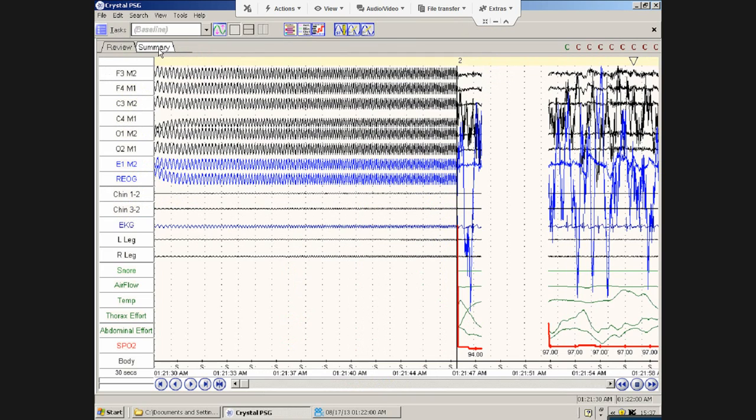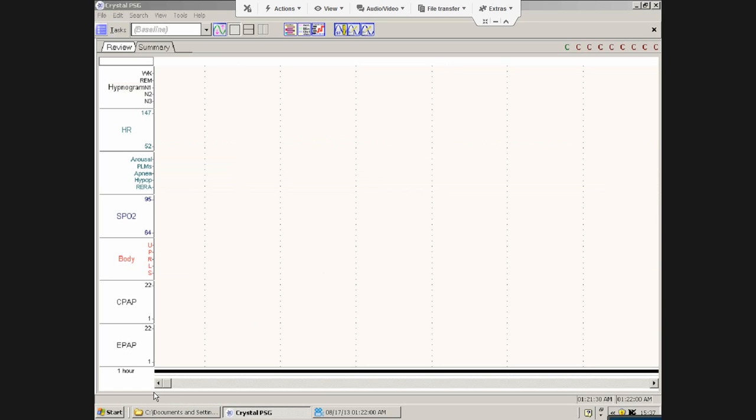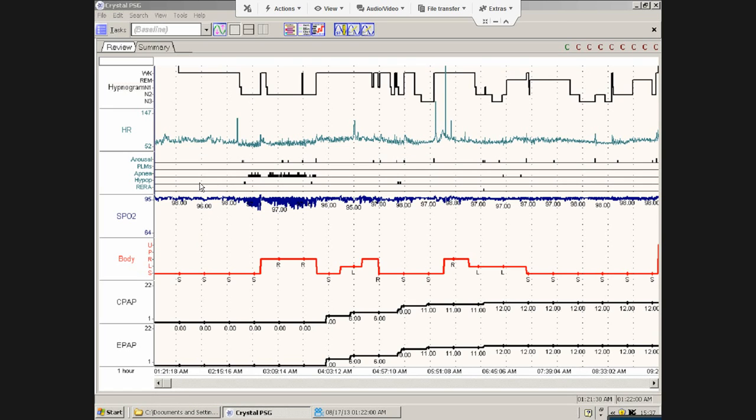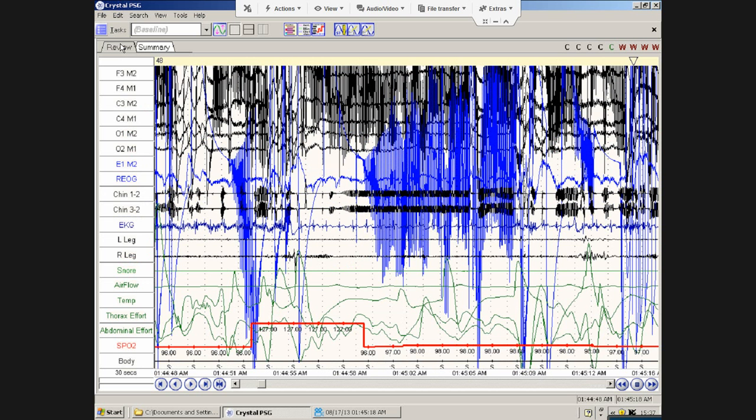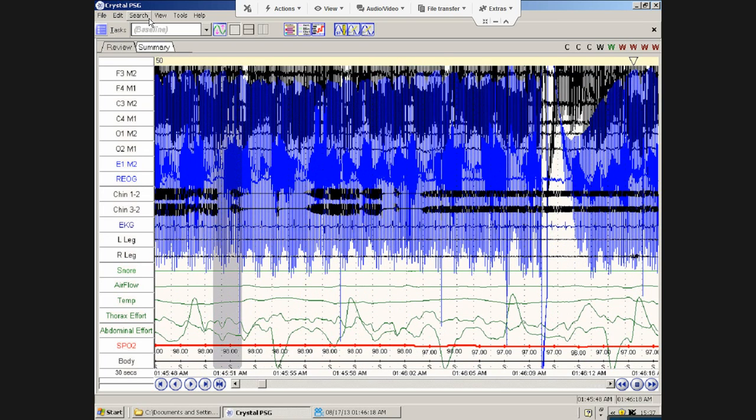just build up the study like we normally do, and all we need to do is find lights on and lights off. As I may or may not have mentioned, one of the nice things about not scoring beyond lights on and lights off is that you get all the sleep stages here, and this first part where it's not scored as any discernible sleep will be this C1. So where would you go there? We would get this and go on forward, and that should have been lights out. Well, let's just make sure that it is.